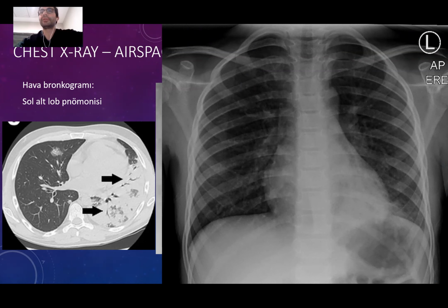It's a very difficult case for the diagnosis because it is behind the heart, people. So I'm seeing the bronchus here very sharply, and I can follow it all the way down. Also, I'm seeing something right behind the border of the heart, some hazy appearance. So there is actually some area of consolidation in this area. This is a left lower lobe pneumonia.